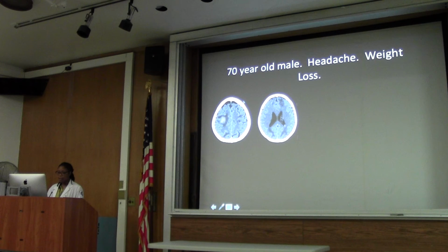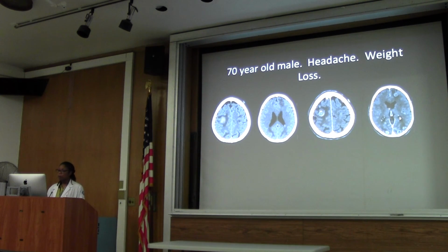So this patient has vasogenic edema and this hyperdense focus in the parenchyma. We do a post-contrast study here. You can see the patient has multiple rim-enhancing lesions throughout the brain. Okay, there's one here, the very first lesion that we saw, and there are others that we don't see. Again, stressing that contrast is very important. You would totally miss all these lesions, and several others, if we didn't give contrast. Okay?